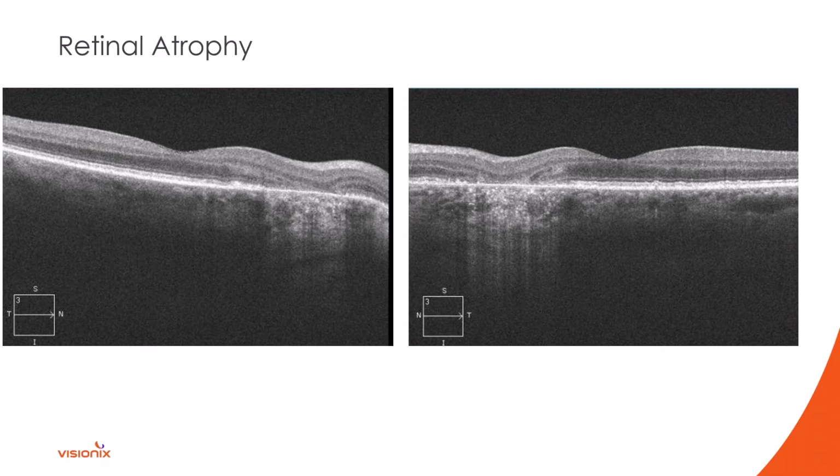And again, you can clearly see on the nasal side in both eyes, outer retinal atrophy. You follow my cursor again, the photoreceptor integrity line is good. Why was this patient 20/20? Because the photoreceptor integrity line is intact underneath the fovea, but then you get over the nasal side and the outer retina completely falls apart here. The inner retina is sinking in.